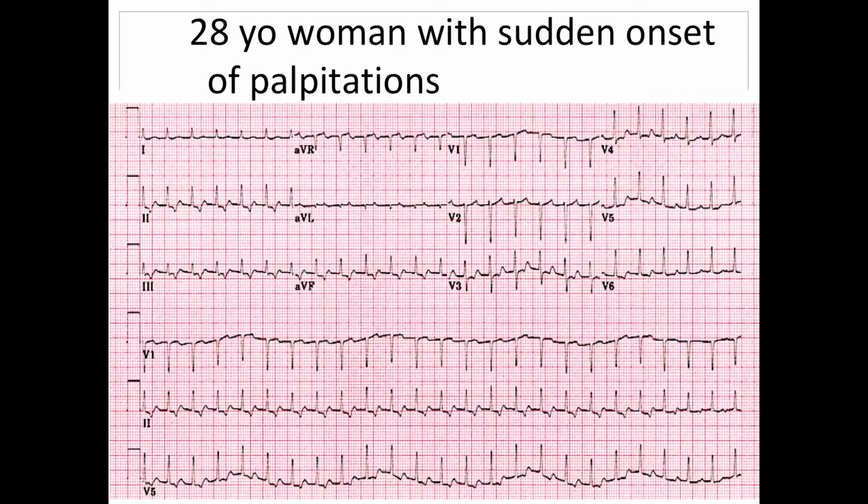Here you can see significantly there's an ST segment distortion that's best seen in leads V3 as well as 2, 3, aVF. Here you can see that there's a small little ditzel right before that positive deflection that makes a T wave after the QRS complexes, and that small little ditzel is likely the P wave, and it's going retrograde. So because it's going retrograde, it's going to be a negative deflection after your QRS complex. Because we've seen this, the differential is either AVNRT or the AVRT that we discussed previously.